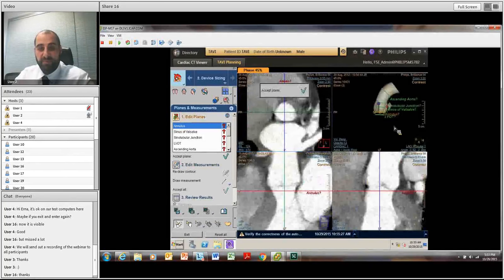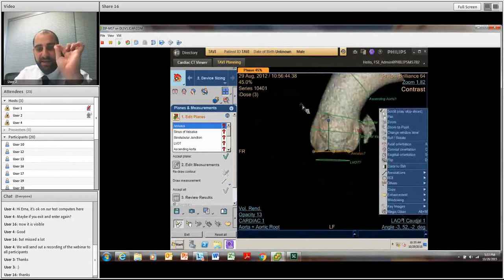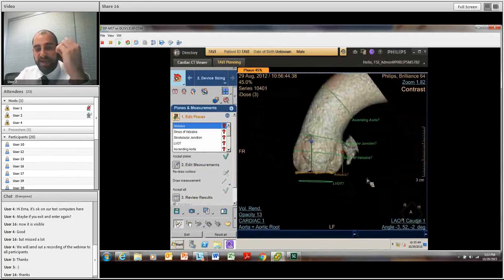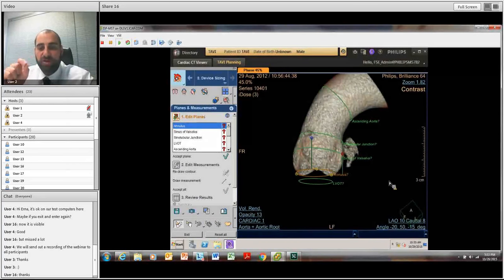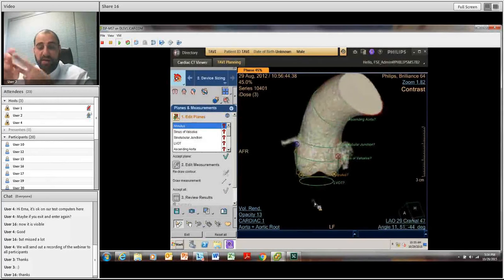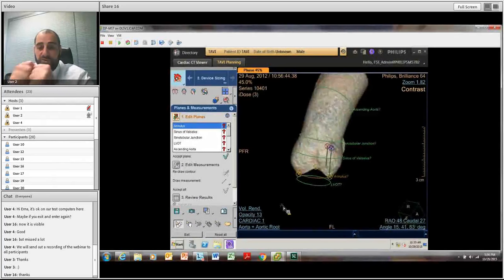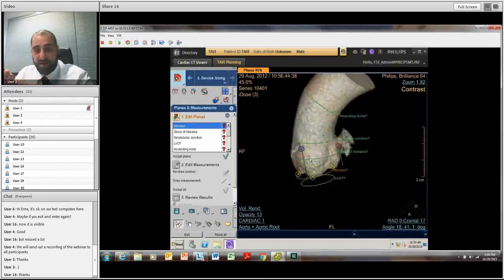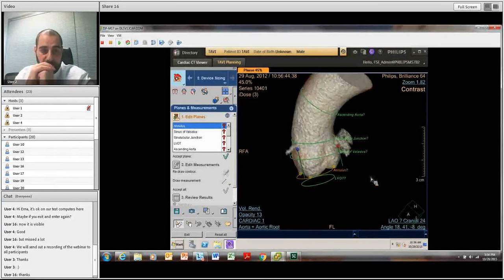So if I double click on the 3D volume image here, and I zoom right up, it now tells me dedicated information. It shows me the hinge points. If you look below on the bottom right hand side of the screen, it gives me the cardiology or interventional radiological angle at which the cardiologist needs to be to see the 3 hinge points, to see in which plane he's going to deploy his stent. And this will reduce the amount of error and give greater confidence to both the cardiologist and radiologist when they're deploying the stent or the actual valve and when they're opening it up.